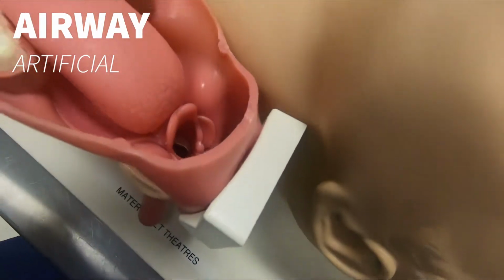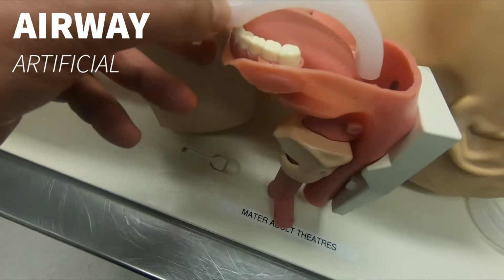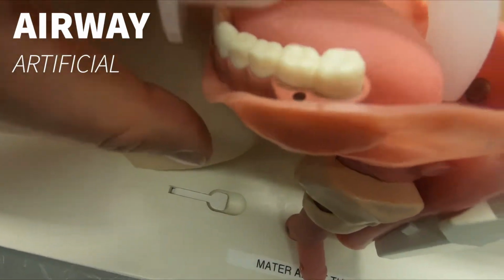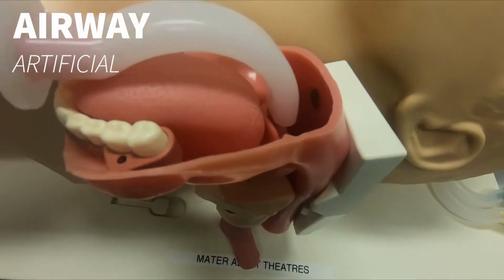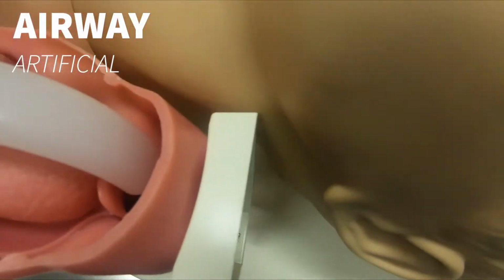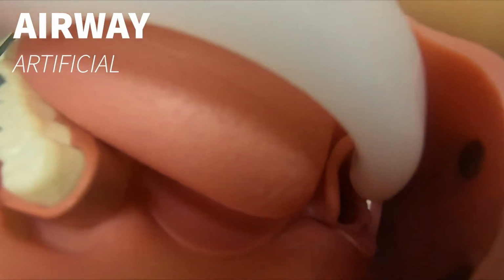If we look in here, we can see why the size is so important. If I place this Guedel here, the red one, properly, yep, you can see that's the beginning of the mouth, and it should go over, it's hard with one hand, over the tongue, holding the epiglottis down, and then it will create this beautiful airway.